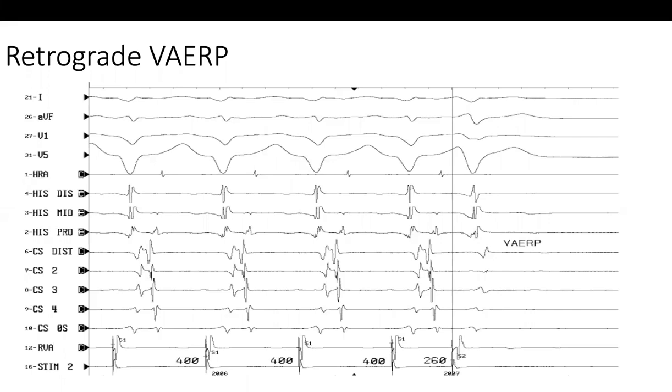Assalamu alaikum wa rahmatullahi wa barakatuh. We have an ECG and intra-cardiac tracing. We have paced rhythm, RV based stimulus. How did you know that this is RV pacing? Because of the spike, we have the RV activity here down. Excellent. So it was RV apex.